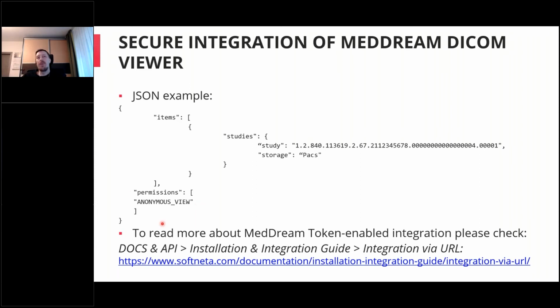It will take the permissions from there, and they will be applied, and not the ones which are in the application properties of MedDream, but the permissions which are here in the permission section of the JSON structure.